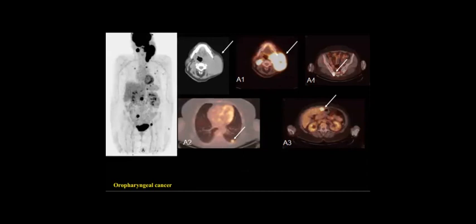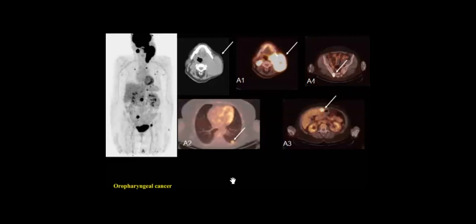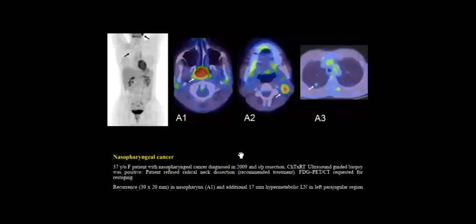You remember the last case we discussed in the last session? It was very similar to this one. Maybe it was again oropharyngeal, maybe it was laryngeal, but at least this one is biopsied and they have already, yeah. Okay, so do you agree? It is clear. Let's shift to another one.